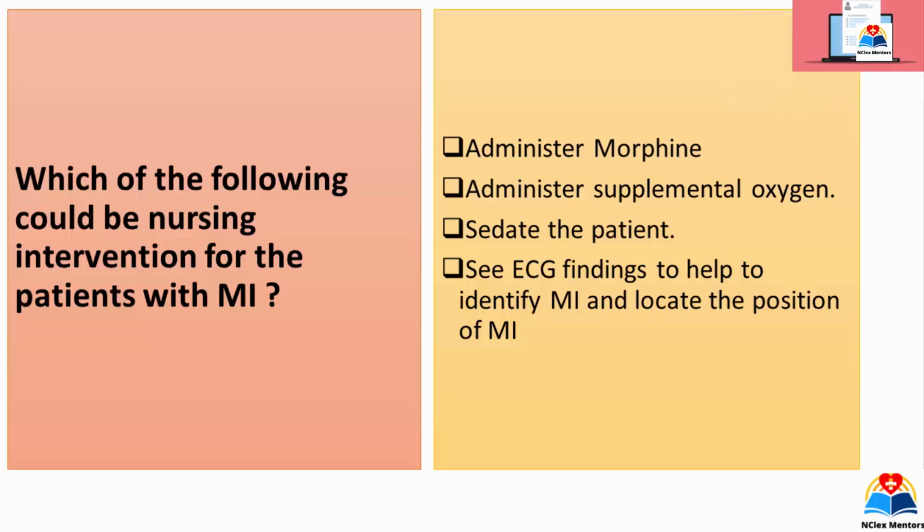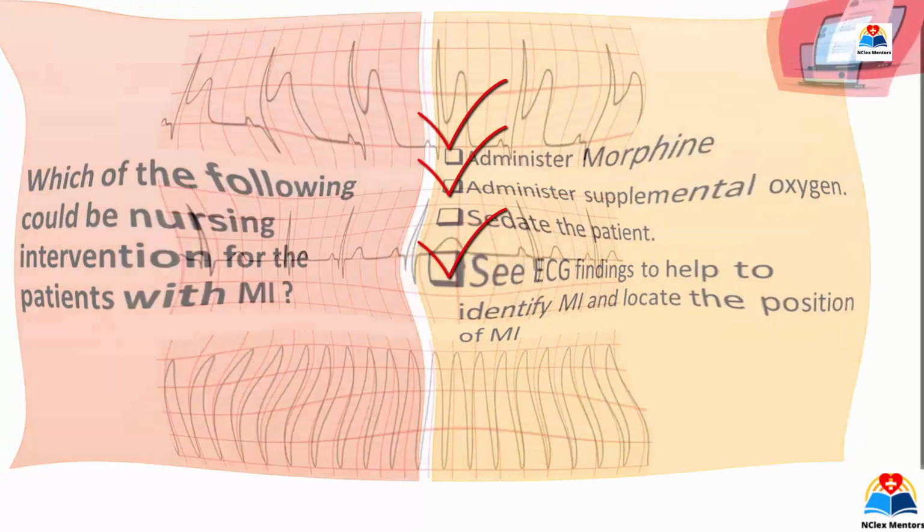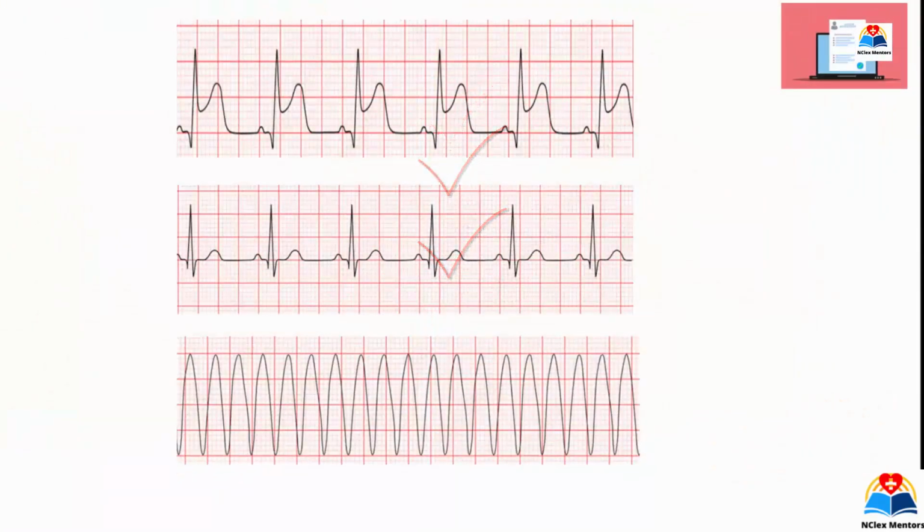Well, there are 3 correct answers here. First, second, and last. I hope you got that right. Which of the following ECG readings is of myocardial infarction?